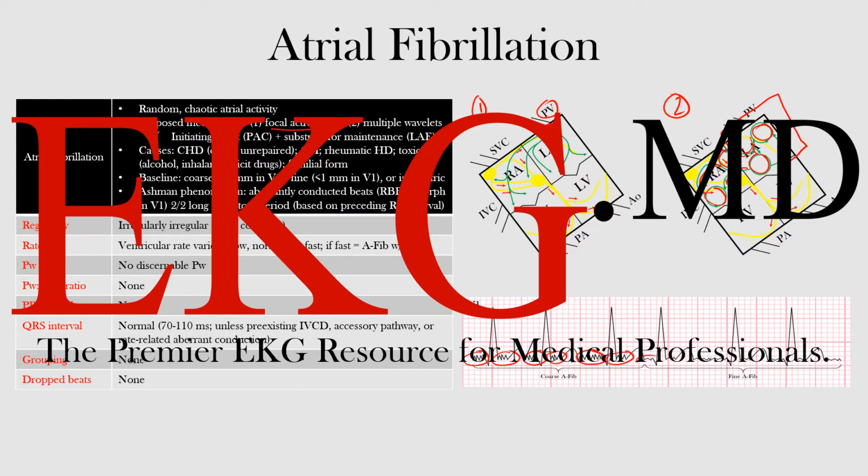All of these throughout, no discernible P waves throughout this whole rhythm strip. And we also said this is an irregularly irregular rhythm, right? And actually, this is the most common of them.